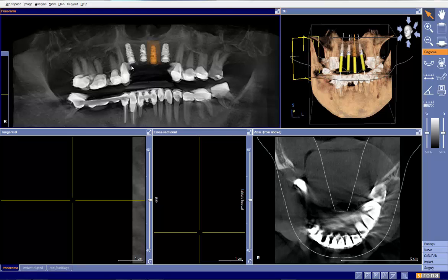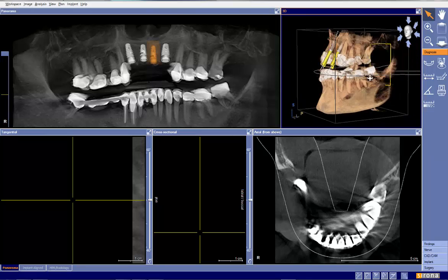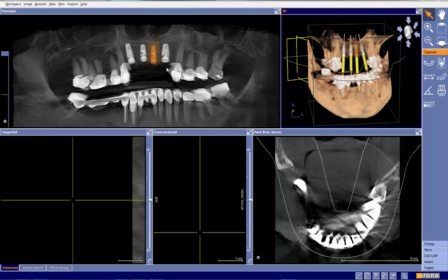In other words, the lab will do a wax up 7, 8, 9, 10 to ideal position, ideal occlusion. Looks like we may have a little bit of a class 3 jaw position here. Then they will duplicate that in barium sulfate, and then you will actually place this appliance in the mouth and scan the patient with that in. So that will allow us to have the virtual wax up.